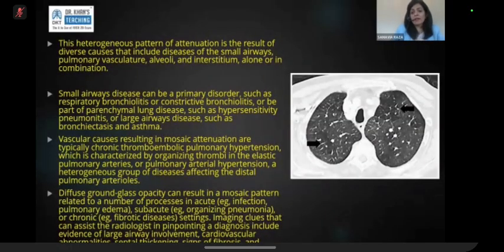If you have a specific diagnosis in your mind, for example, if you look at that CT scan, if you've made up your mind that the cause is vascular, you can find a specific area in the lung that will make you happy, and you will be able to diagnose it that way or describe it that way. So I wouldn't put too much stress on the vascular appearance. This is more literary or more exam oriented. In real life, or even for diagnosing cases or reading cases, for the exam point of view or the viva point of view, you wouldn't really be expected to have a very specific analysis that would be helpful.